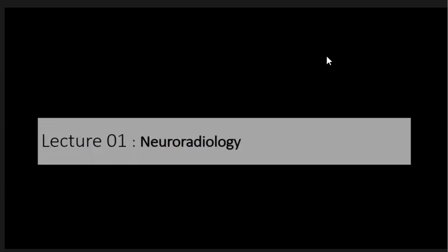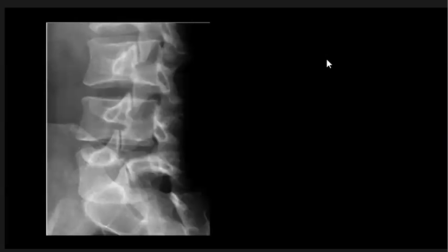I started the spot diagnosis series in neuroradiology, hoping these spotter cases help you in your examination. Here, this is our first case, and as we see here, this is spondylolysis, as we see defect in the pars interarticularis.